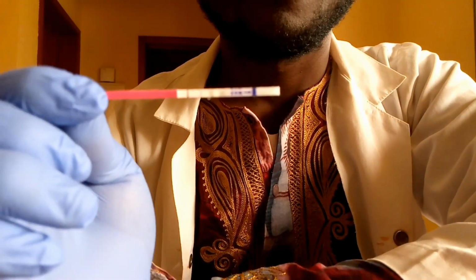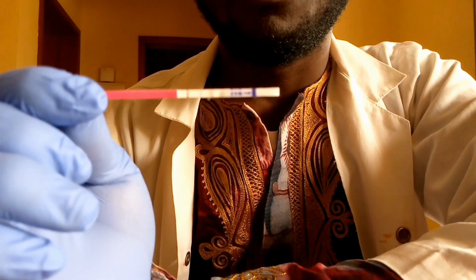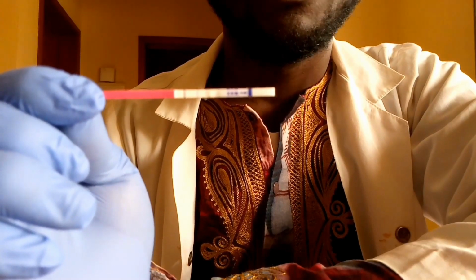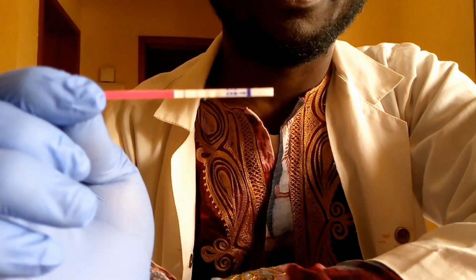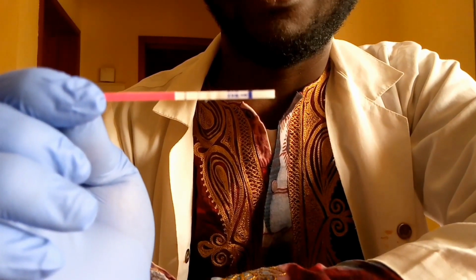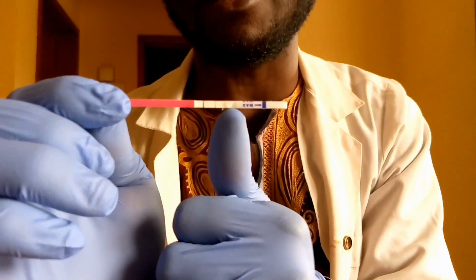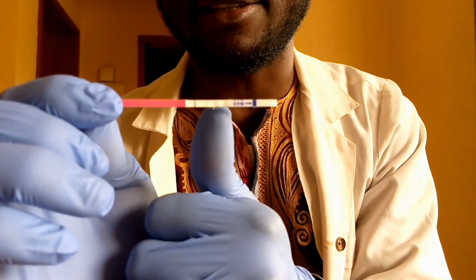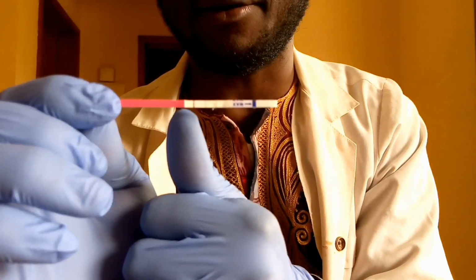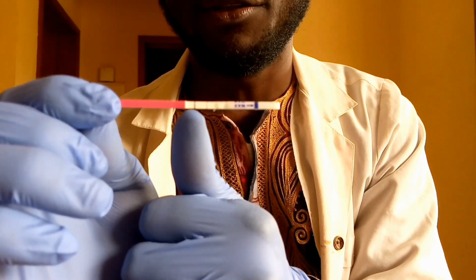So this is ovulation. This is an ovulation result using a urine sample. And if you look at this result, you will be saying that, oh, it is a positive result. No. This result shows two lines. And as you can clearly see, there is a first line from the direction where we apply our sample. And this line, we call it the test line. And there is a second line away from the direction where we apply our sample. This we call the control line.